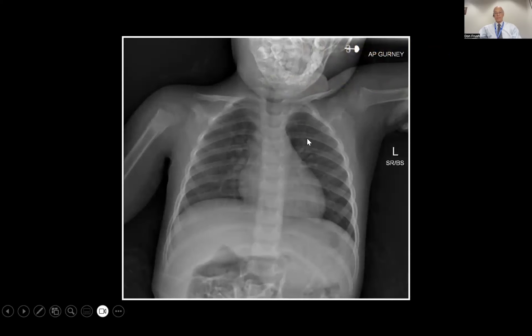Now, remember, talking about the 5-4-3 rule, and I'll talk about the 4 and the 3 because I've just talked about the 5 with the chest X-ray, but the 4 part of that applies to an abdomen film, and the 3 applies to extremities. So we're looking at a chest X-ray here. This is a child, maybe 2 years of age, normal lungs. Your heart and mediastinum look pretty good here. No pleural thickening or pneumothorax. Upper abdomen is normal, et cetera.